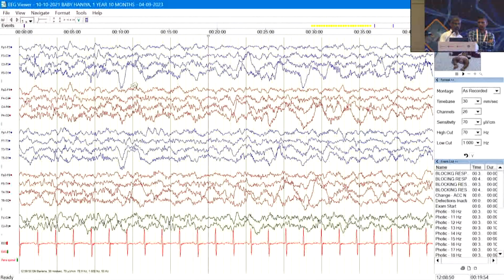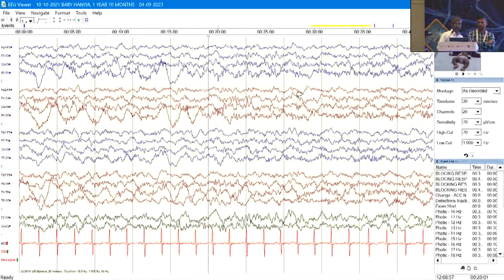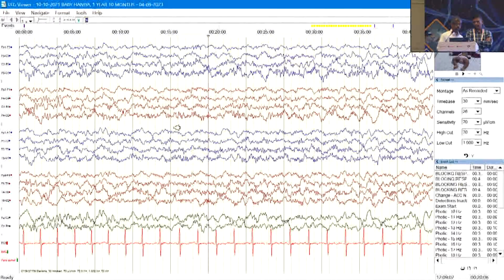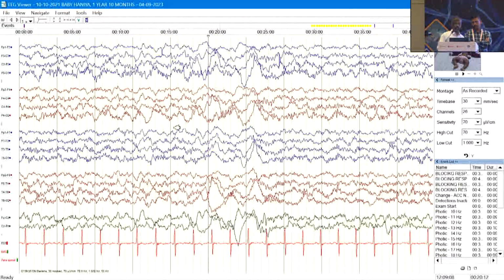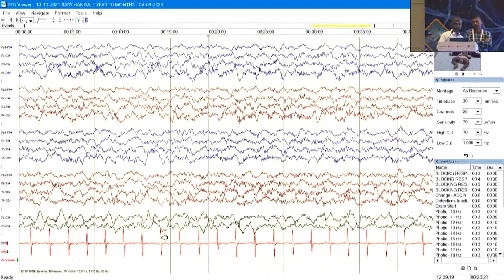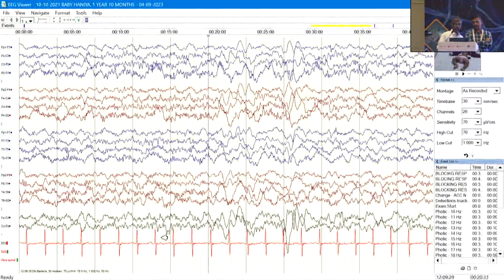So this is the posterior sharp delta activity we were describing. Some of these are the cone waves, and sometimes these are the good examples for the posterior delta slowing, which is normal physiological. So many times beginner, inexperienced EEGers report this as occipital slowing or occipital spike. Okay, so that is the importance of why we need to identify this as a normal physiological pattern for this age.